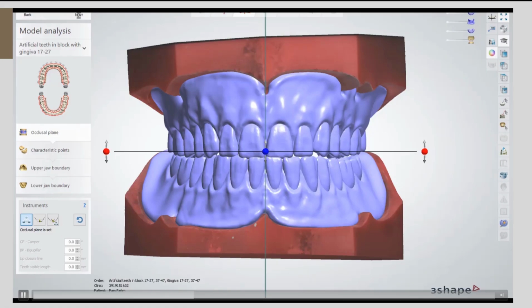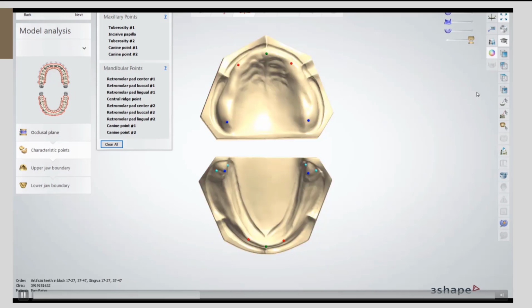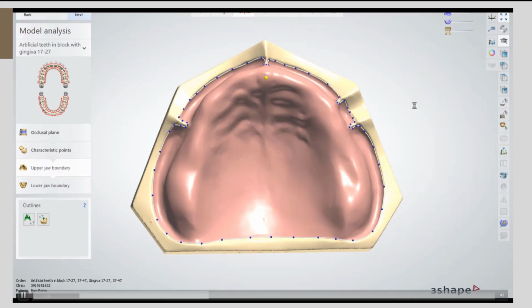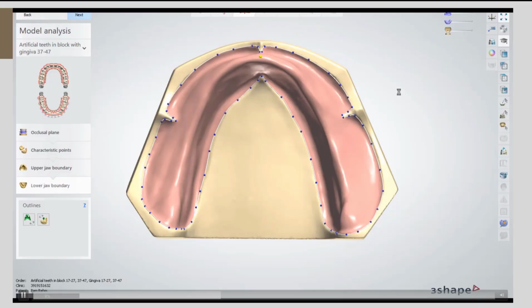So at this point, everything that we've designed is going to be in the same position. And so I can click next, next, next. Now, if your bite changed ridiculously drastically, you might have to change the boundary on your lower arch, because your lower jaw is what's changing. And when we get to the tooth setup, I will explain a little bit better exactly what's happening.